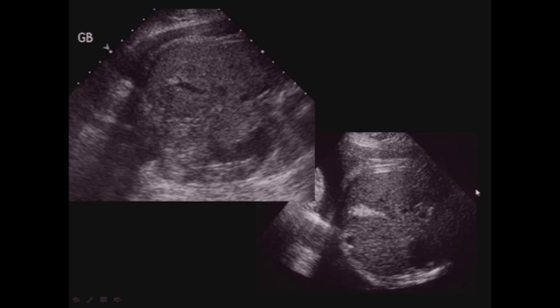What else can we see in utero? I'm sure that most people who have done obstetrical ultrasound will have seen this. This is a transverse image in the upper abdomen, and here we have the gallbladder, and right in the fundus of the gallbladder, the echogenic lesion with posterior shadowing, and of course this is a little gallstone. Now, sometimes you can see the focal gallstones like this, and other times the gallbladder will completely be chock full of all of this echogenic debris. Both of them represent gallstones.